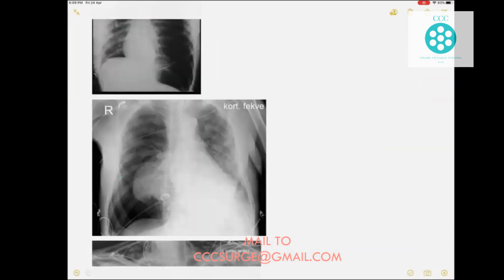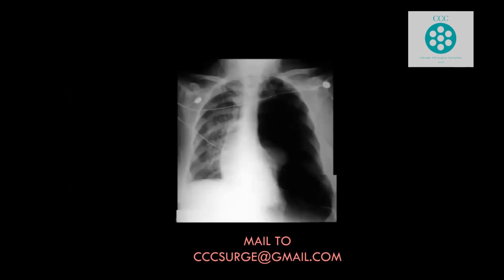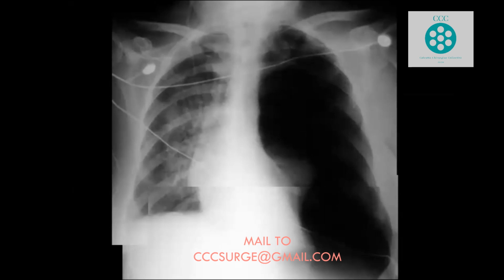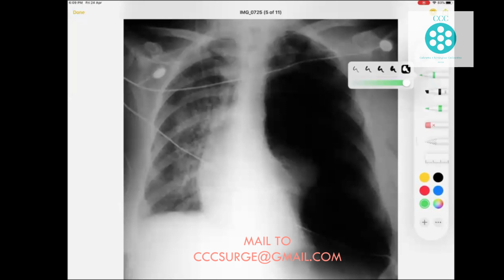Now, on the other hand, see these two pictures. If you have seen that here, this is again here. What is so bad about this? Now again comes your ABCDE. If you are thinking about ABCDE, then what is the state of the trachea?